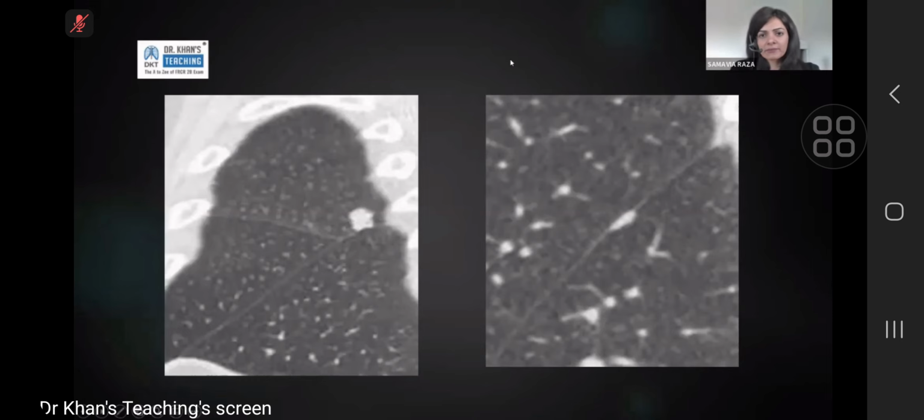the same way. So just looking at these two slides, give me some thoughts about these two. The first, this one, and tell me what you would do with it. And then we'll come to the second one. Okay, 30 seconds starting now.